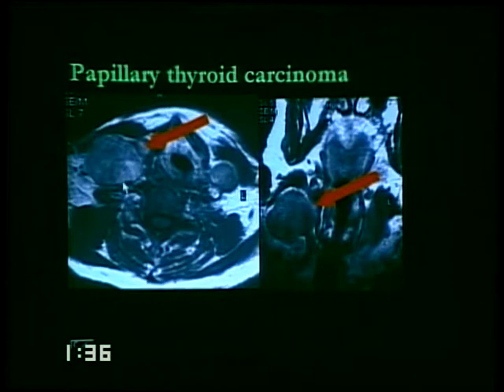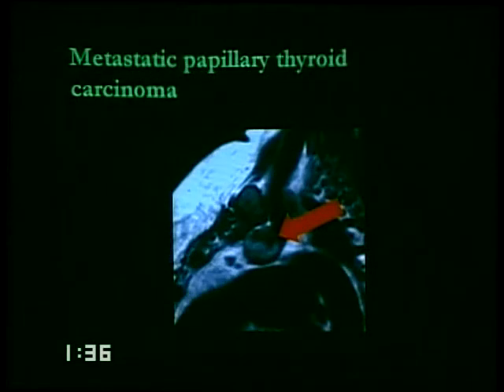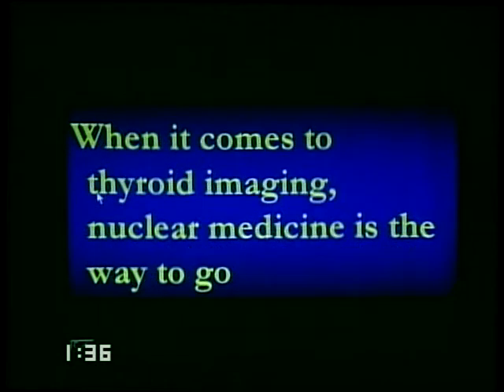Papillary thyroid carcinoma can look exactly like that. So you're using the anatomic studies only to guide biopsy or to plan radiation therapy. You really can't make the diagnosis based on the architecture themselves. This is a brachial plexus study with involvement of one of the cords using papillary thyroid cancer. So CT and MRI, not really good in determining whether or not the cancer is spread.